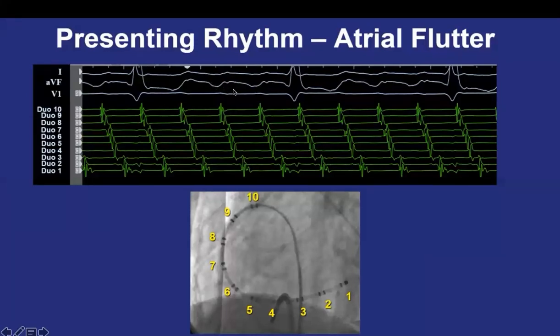The surface ECG, first of all, as we said earlier, the atrial tachycardia will not show continuous activity, it will show focal activity: isoelectric line and P wave, isoelectric line, P wave. While this one is a continuous activity, as mentioned by Saleh a while ago. Second thing is the rate, the AA interval. There are no certain numbers, but people refer to 250. Anything less than 250 might represent atrial tachycardia. Anything more than 250 might represent atrial flutter.